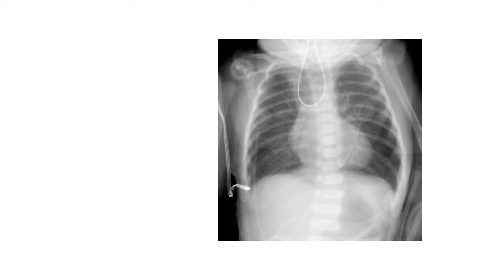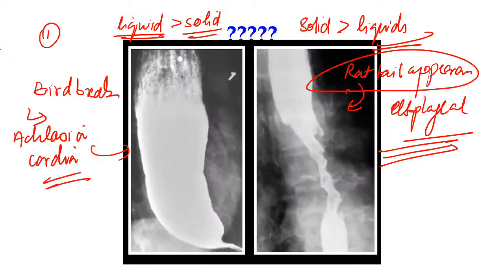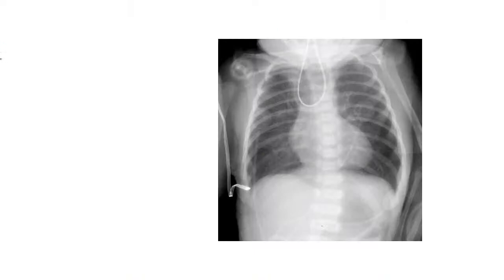What are we able to see in this image, guys? Anyone?